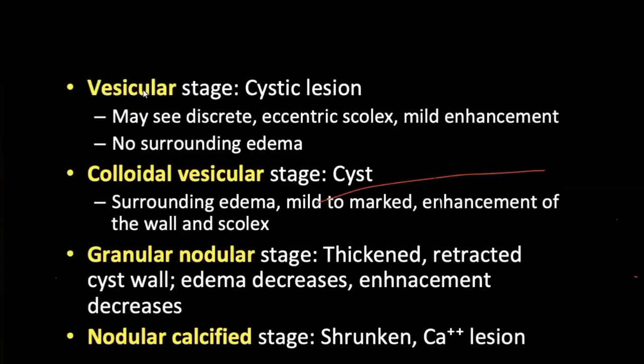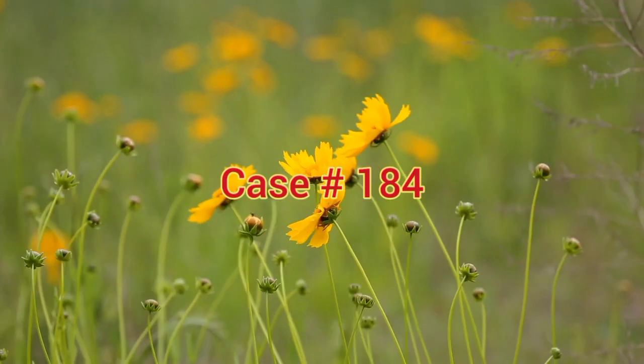You can read from the book. But the teaching point in this case is, if you have ring enhancing lesions of different stages, so these are like they're dying. One is like a live parasite, some are in a different phase of their degeneration. So this is the only disease which usually does it. So again, if you have eccentric enhancing nodules like a scolex, okay, and if you have variable phases of the lesion, some have diffusion restriction, some don't have diffusion restriction, so that will be neurocysticercosis.